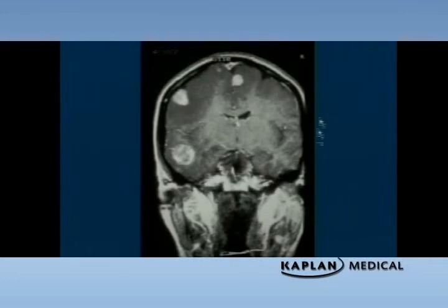This is a person who's got an MRI showing multiple metastatic lesions. That's a metastasis, that's a met, that's a met. The dark stuff is the edema in the brain surrounding the metastases to the brain. This person needs steroids. Steroids in the brain are to decrease the swelling surrounding cancers and infection, decrease the risk of herniation, decrease the risk of seizures. Cancer, edema, give them steroids.